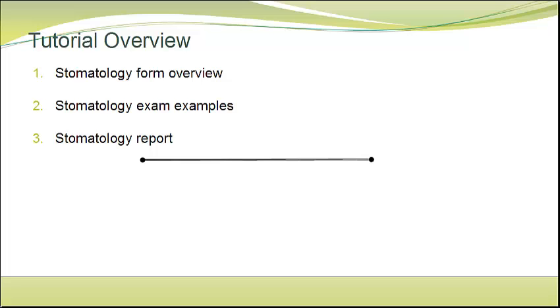Welcome to tutorial 19. In this tutorial, we will review the stomatology form. We will go through a couple of stomatology exam examples, and finally we will generate a stomatology report.